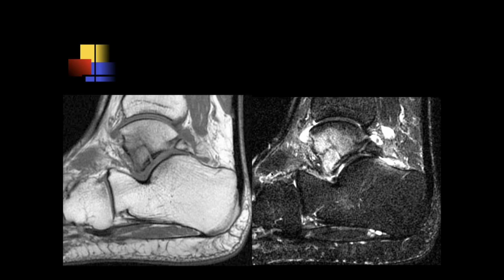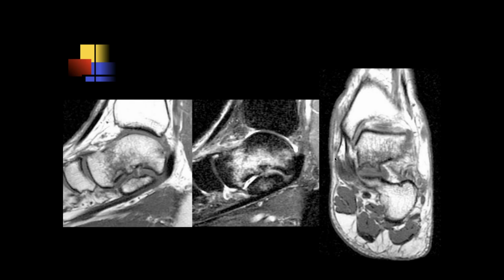Ashu, what do you think of this case? Looks like there's a lot of edema and a fracture of the lateral talar process. And it's not displaced. Right. Jennifer? Okay, so there's lots of edema here, within the neck of the talus, and it looks like there is some impaction there. So I guess there's an impaction fracture injury, impacted against the calcaneus. Good.